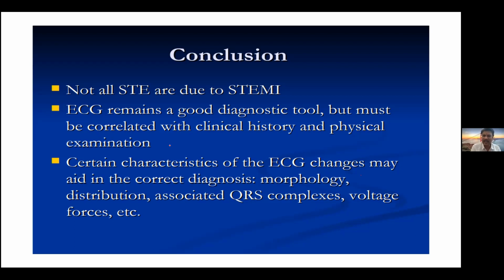There are certain characteristics like the magnitude of the ST elevation, morphology, width of the QRS complex, and secondary forces, left ventricular forces. Everything determines the ST segment rather than only acute MI. So look into every aspect and take a call. ST segment elevation is very important, but diagnosing is also very, very important. So this class is only dedicated to ST elevation.